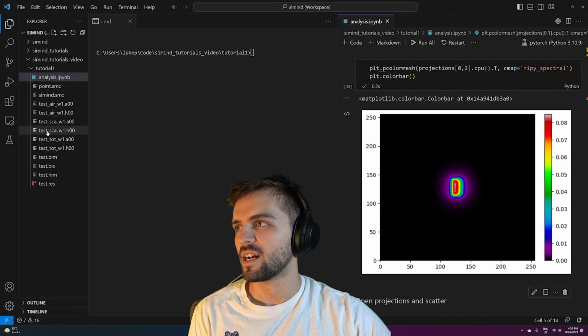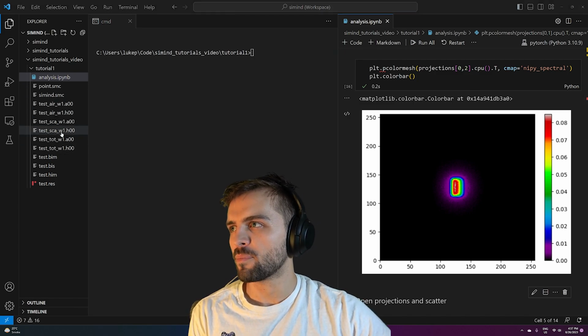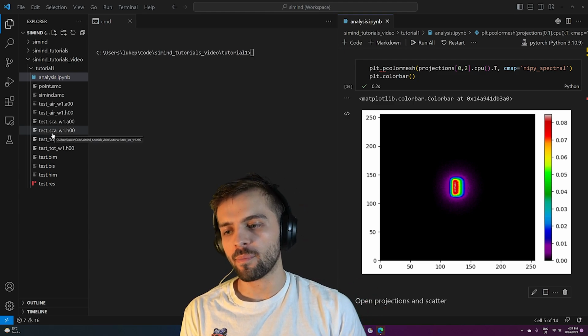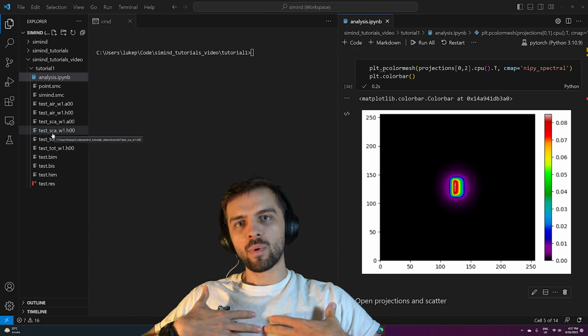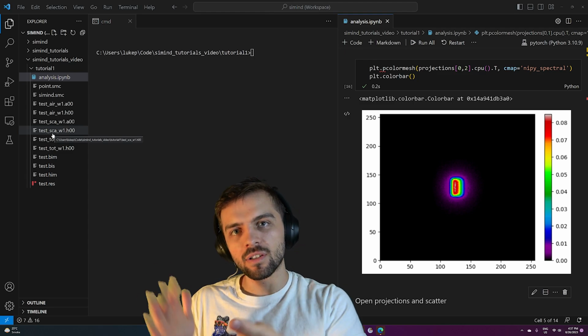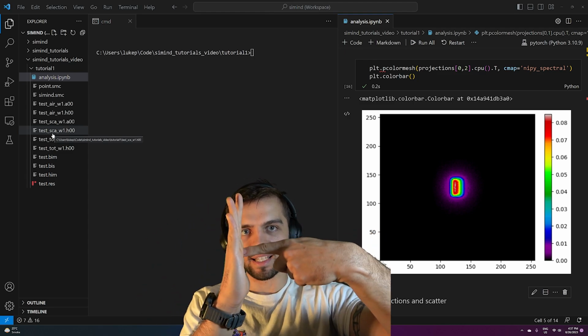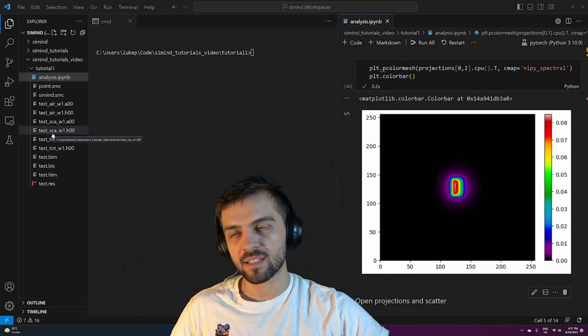Okay, so one thing you may have noticed is that there's not just the total that's output, there's also something called SCA and air. Now we won't focus so much on the air images, but the important thing is the total image and the scatter image. Now you'll recall from a SPECT scan that the way the collimators are set up, when photons are emitted, it only allows photons that are traveling perpendicular to the head of the scanner, so they have to be coming in like this to be detected. If a photon comes in like this, or like this, of course it gets rejected.